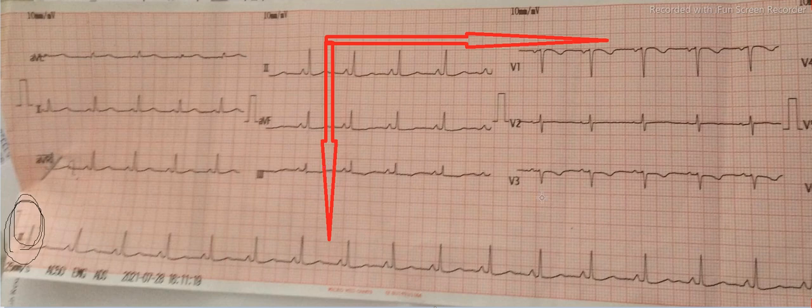Now what you do is you see lead 1. So this is your lead 1. You see here, let me draw it with a circle, the QRS complex. This is our QRS complex, and it has positive deflection. So what do you understand if they have positive deflection? If a given QRS deflection is positive, so you see here this is your 0, and that means origin.